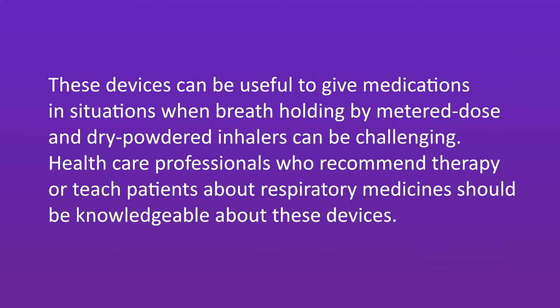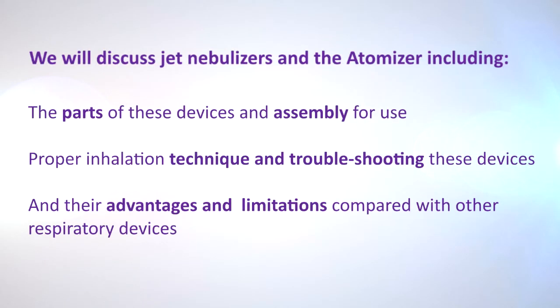Healthcare professionals who recommend therapy or teach patients about respiratory medicines should be knowledgeable about these devices. In this video, we will discuss jet nebulizers and the atomizer, including the parts of these devices and assembly for use, proper inhalation technique and troubleshooting these devices, cleaning, replacement, and storage of these devices in between use, and their advantages and limitations compared with other respiratory devices.